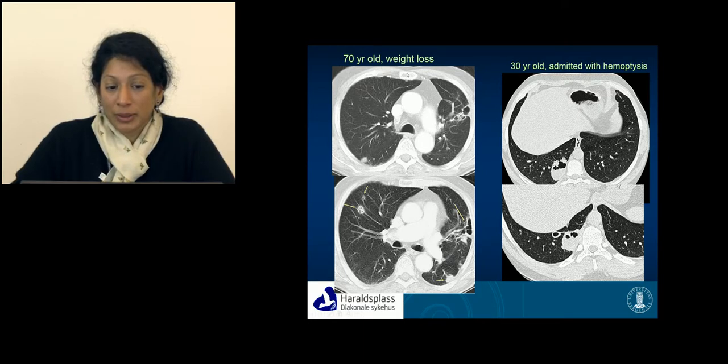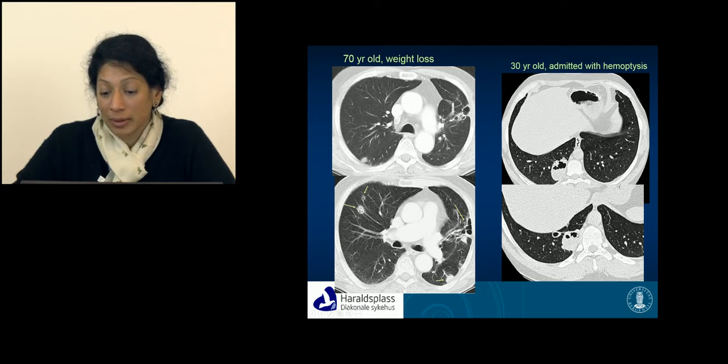So you have a patient who was 70 years old, he had pancreatic cancer and he had metastasis in both lungs. On one side there were more nodules and on the other one it was also metastasis, but they were more cystic-like. So you should remember that just because it's cystic or thin wall doesn't mean it's not malignant. There's another patient who had a cavitary lesion with fluid air levels, and this was a bronchogenic carcinoma. He also had a satellite metastasis, and you should remember that also a solitary tumor can have cavitation.